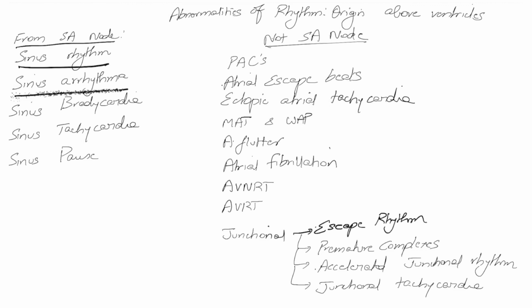Now, in sinus arrhythmia, everything looks similar to a sinus rhythm, with the exception that there's slight irregularity. The heart rate goes up when a person inhales and goes down when a person exhales.